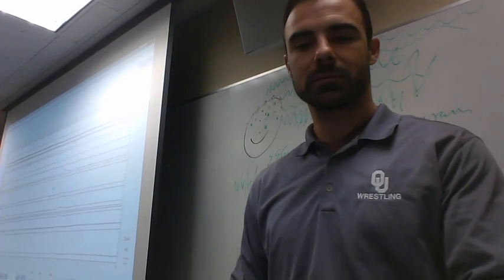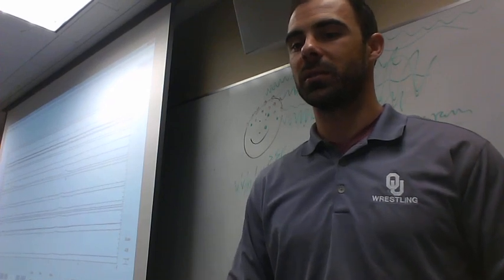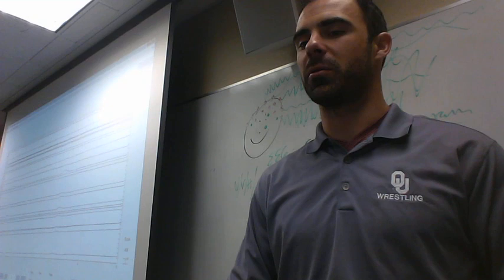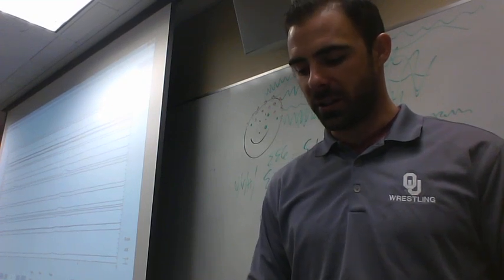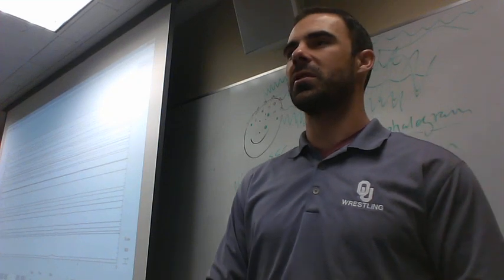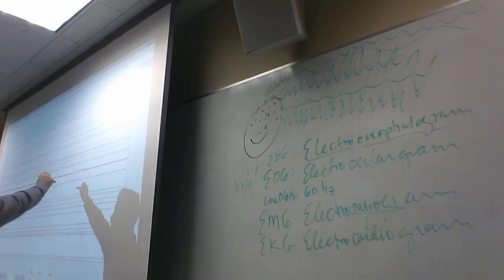Okay? So this scale is massive, 400. Okay, I'll even type it up to try 800. Okay, we can start to see how, but of course, the reason we did this was to answer your question. Each of these electrode sites still only has one trace.